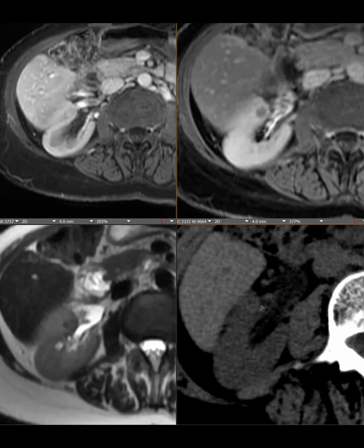We don't have the con, but we do have the post-con on the MR, and so we've been calling it some RCC of some sort, and we suggested papillary because it was too dark. It enhances, kind of washes out. And then I saw the non-con, and I think, like you said, it's a lipid poor AML because it's dense on non-con. We don't have the path. The patient's on active surveillance, so we're not going to get the path.